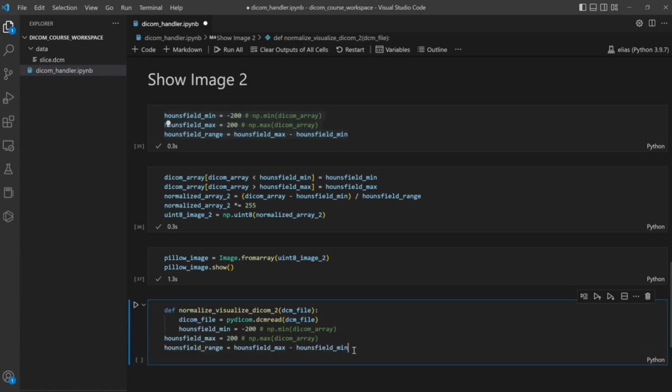You see that now we are just organizing our code. If someone is writing code at the beginning, he can work however he wants. If you are testing something, you can test it, but once it works, you should always organize your code. I don't recommend leaving everything to the end of your project and then organizing the code, because there will be a lot of things to change, and it will be tedious to do. So I prefer doing it as you go. Since this works, now we can organize it, and the same for the others.